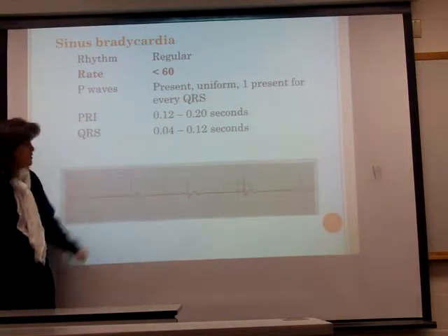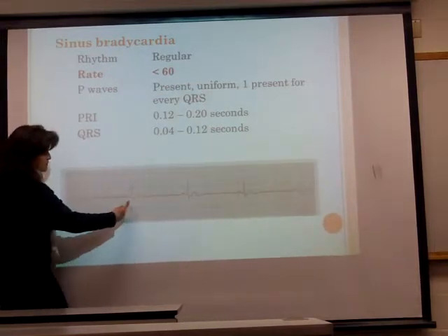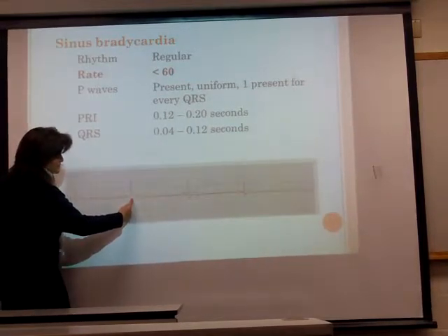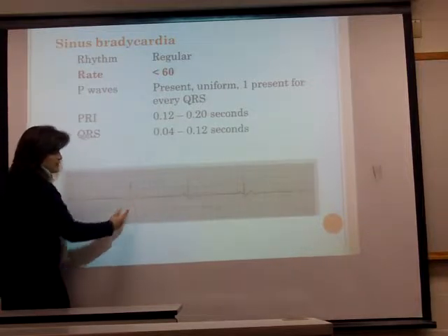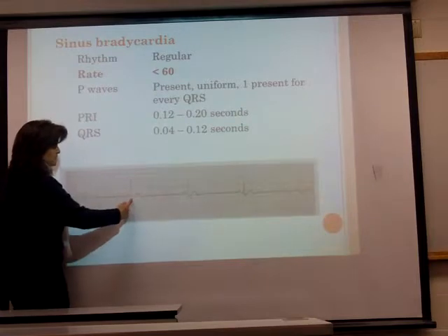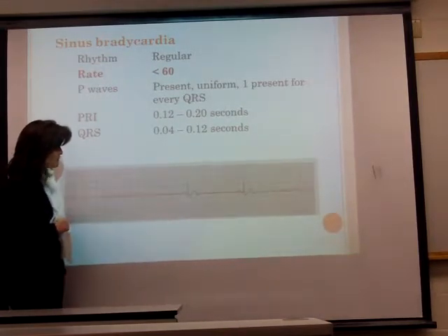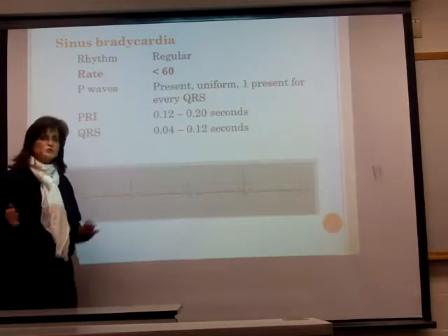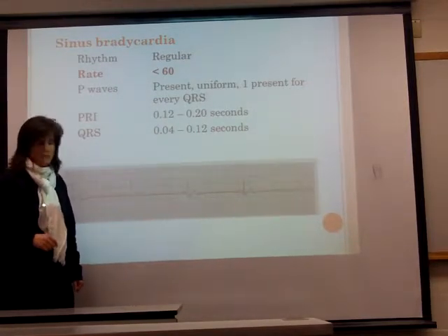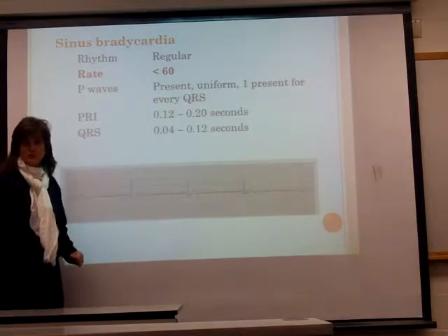I look at my QRS. Remember, I have ST segment involvement. So when my S wave comes back up, I've got to pick it back up to about here, because if the ST segment were normal or not involved, that's where my QRS would end. So my QRS here is about 1.5 boxes, so about 0.06 seconds, very normal.